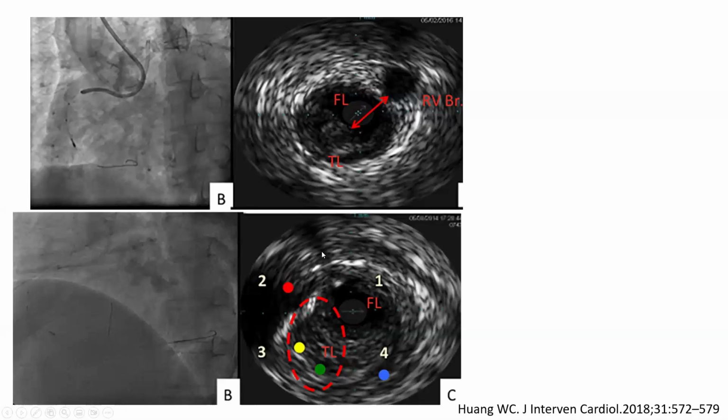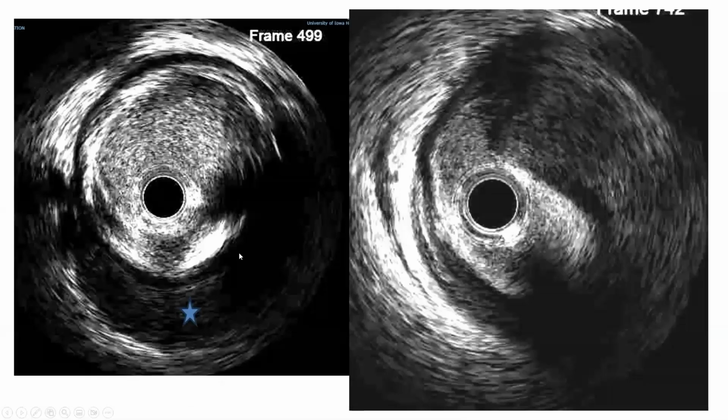intima here is white. This is another image from a SCAD subintimal hematoma, but it's the same morphology. It's a crescent, banana-shaped dark structure with white speckles, and it gets darker as you go deeper. And this is the intima, white. Again here, this is that subintima, dark crescent structure, whereas the intima is white.